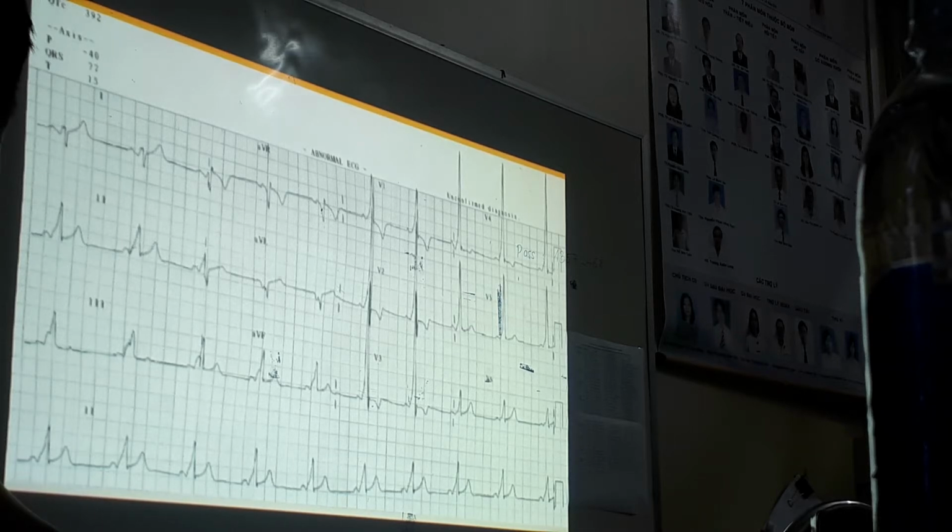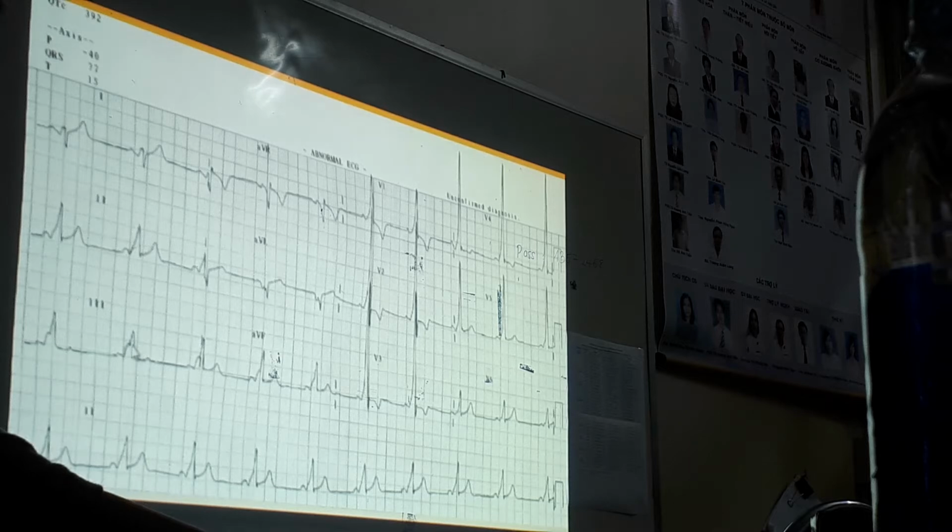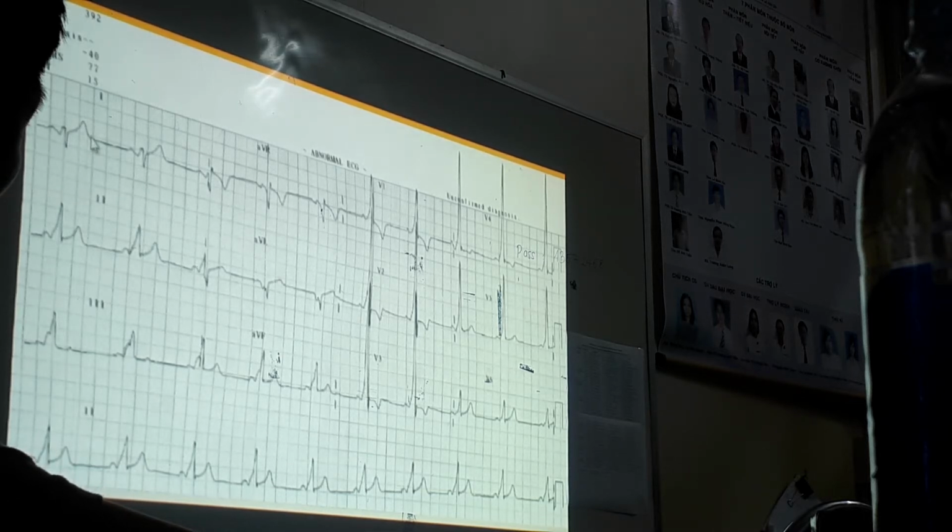Wolff-Parkinson-White. Full Wolff-Parkinson-White. Okay, this is pretty good. It's full Wolff-Parkinson-White. Do you want to go step by step? I go rate, rhythm, and axis. So rate. What do you think for rate? 60. All right, perfect. 300, 150, 100, 75, 60. Between 60 and 50, actually. Okay. Rhythm.